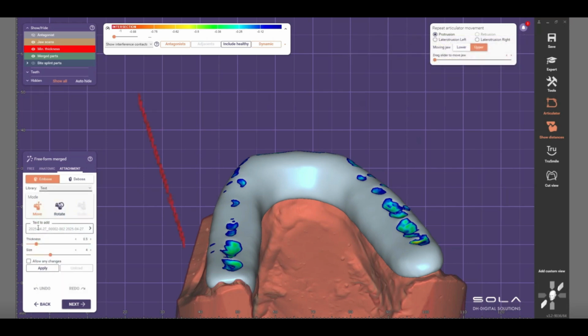Text, and then now this is the name it gives you. That's the file name. So I click on the text to add the name of the person. So if you want to add any name of the person, that shows you what you want to add there. You can add the name of the person, name of the text. Now there, you can always, now protrusion will be over here.